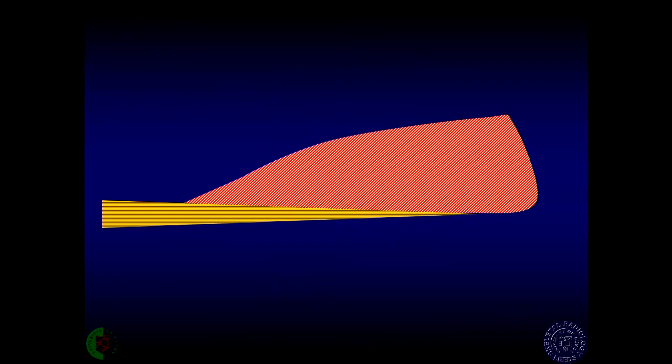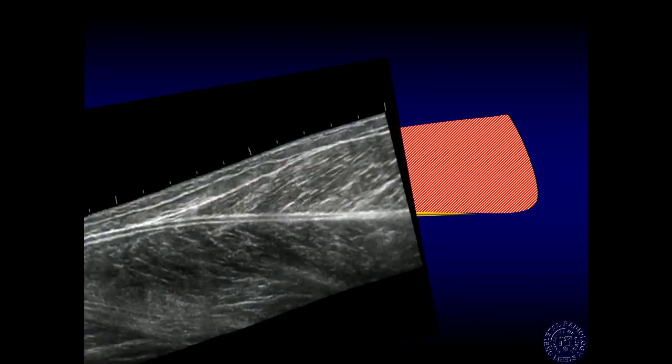And this is the typical appearance of a unipennate muscle. Here you can see I've used the gastrocnemius as the example to overlay across this muscle. And you've got the head of the patient over here on the right of the screen and the foot of the patient over here on the left. And you can see the gastrocnemius fibers coming to insert down on the myoaponeurosis that extends inferiorly to form the Achilles tendon.